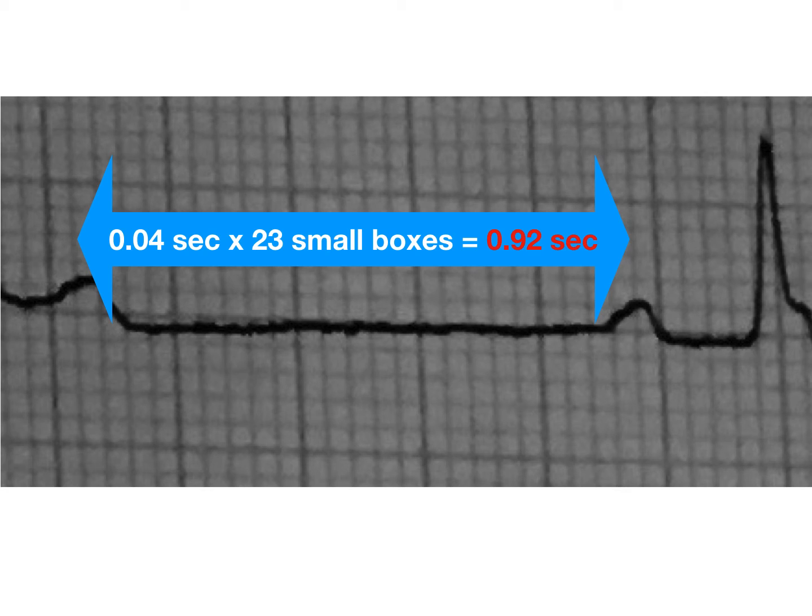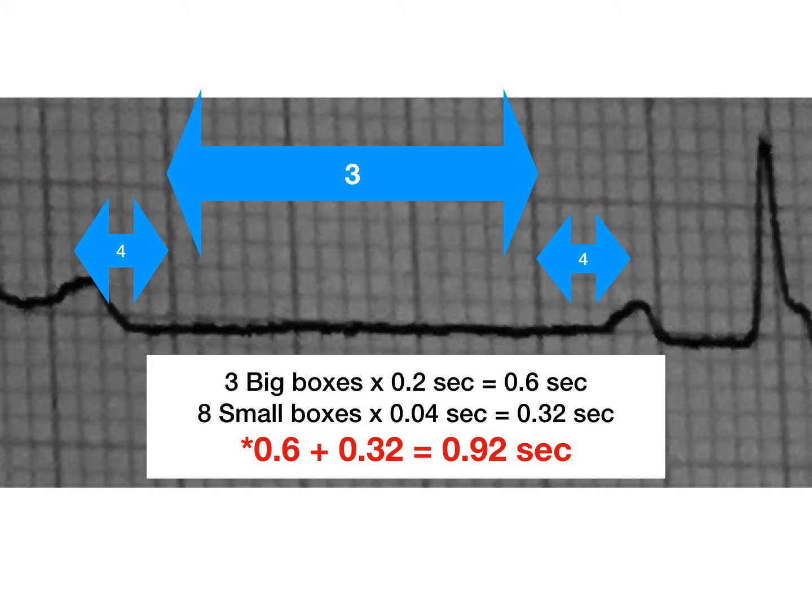But there's another way that we can do this, by just counting the big boxes and the small boxes at each side. At the top arrow, you can see that there are 3 big boxes and 4 small boxes at each side, 8 in total. So 3 big boxes times 0.2 seconds would equal 0.6 seconds. And 8 small boxes, 4 at each side, times 0.04 would equal 0.32 seconds.